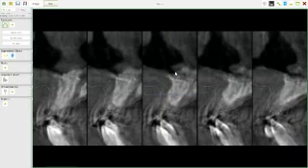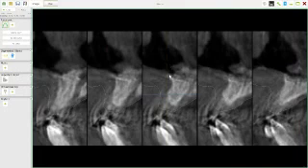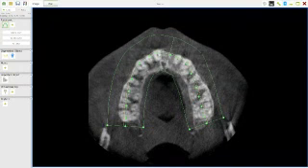And this center one is where that green line is. So if you like, this green line here represents that part there, that slice right the way through there. Yeah? And if I go to here on the actual view and I hit my space bar, the green line is actually there between the two teeth, and that's looking at it from the actual view.